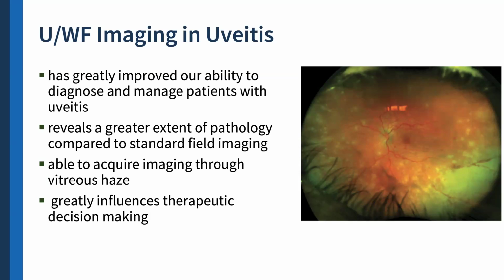Sometimes these machines can actually see the retina better than even your IO. Okay, so what's unique with the Optos machines is that it's able to actually penetrate vitreous haze up to +2 vitreous haze.